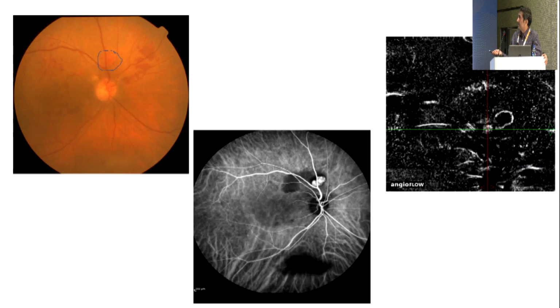This is one of our patients. You can see there's a subretinal polyp here. The ICG shows a bunch of polyps here, and one polyp is seen hyperflow, and this is hypoflow. So hypoflow polyps are likely to respond better to treatment.